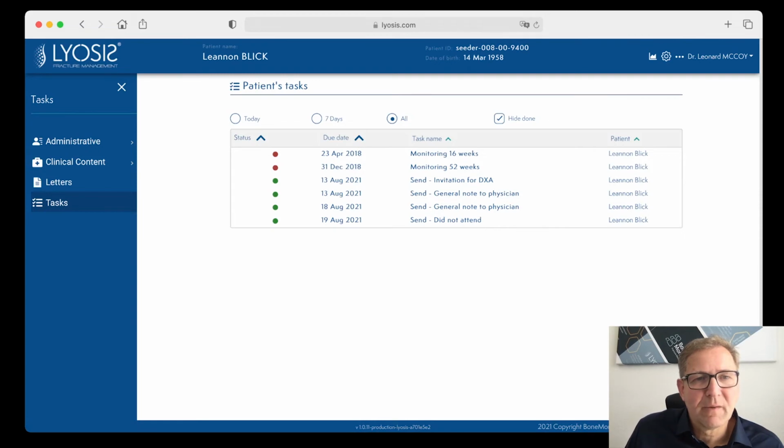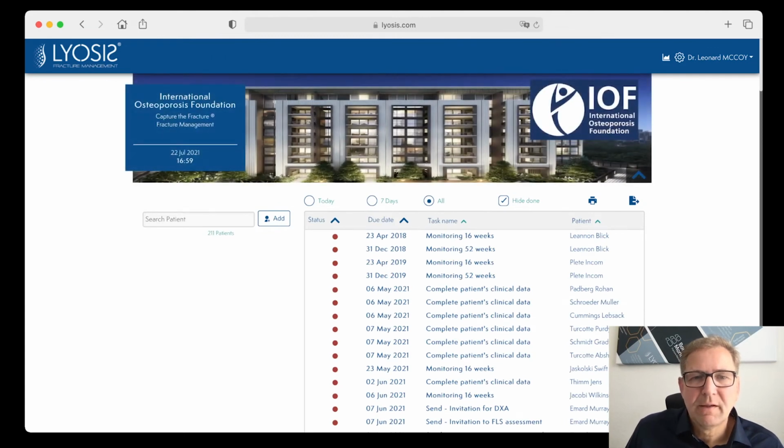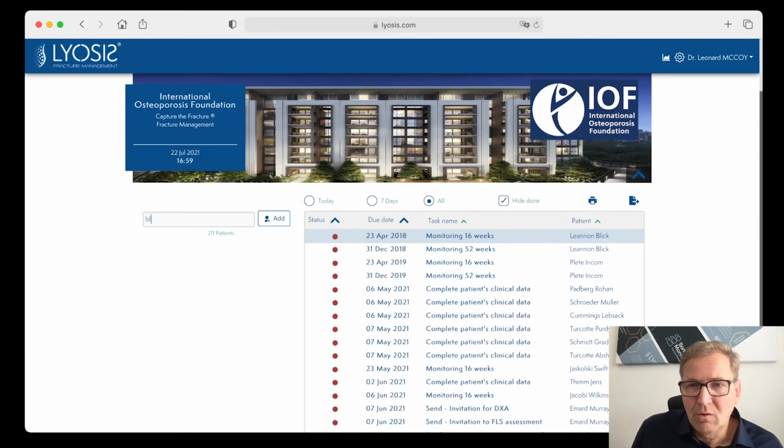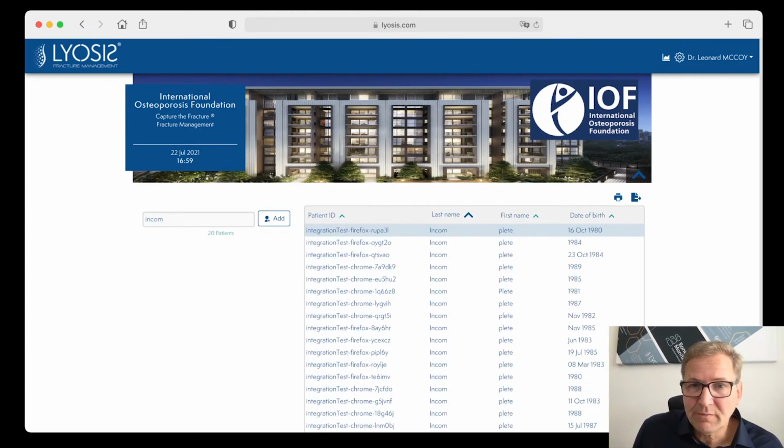Okay. Going back to the dashboard, you can also search for patients like this one, or this one.